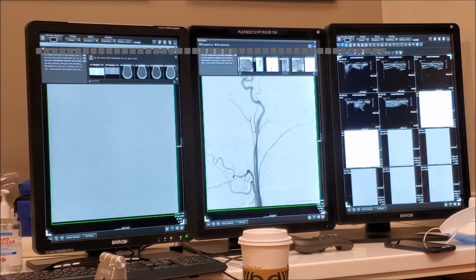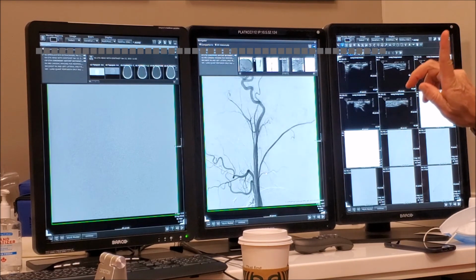So when you're choosing the safe embolization point for epistaxis, right, when you're going through IMAX, when we pass the inferior orbital, then everything beyond that should be safe, including. It's safer, no, but the infraorbital still can give you a palpebral and go back there. Yeah. But it's also pressure of injection and size of particles. You know what I mean?